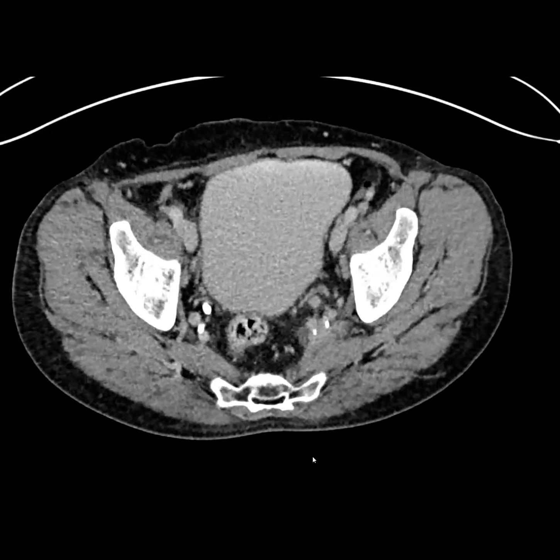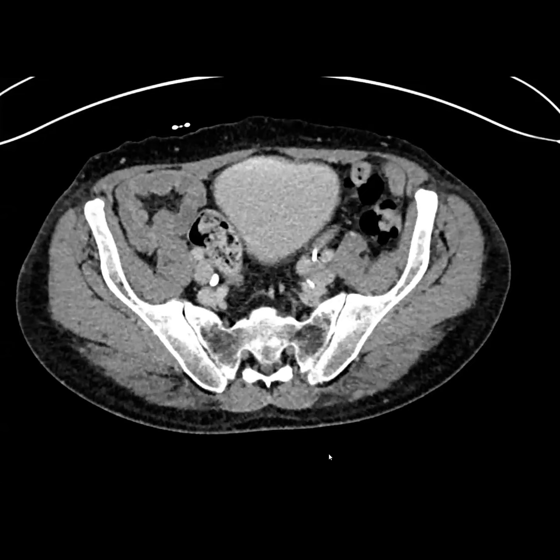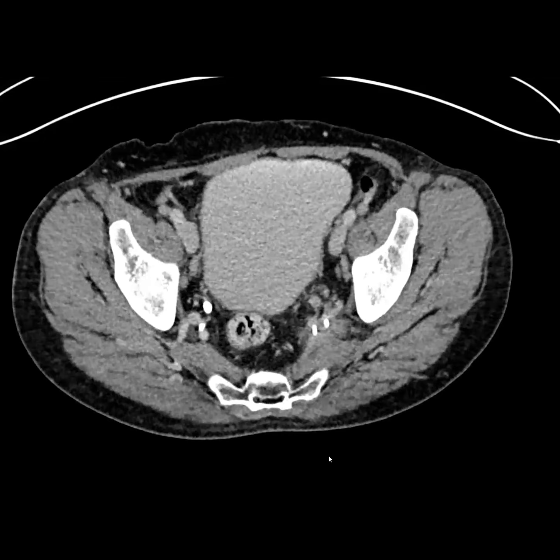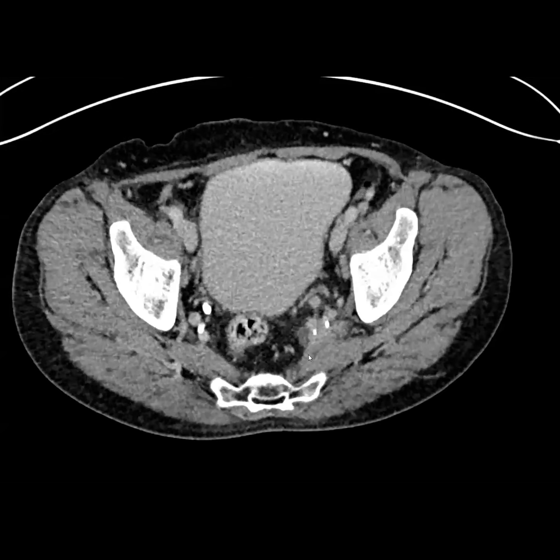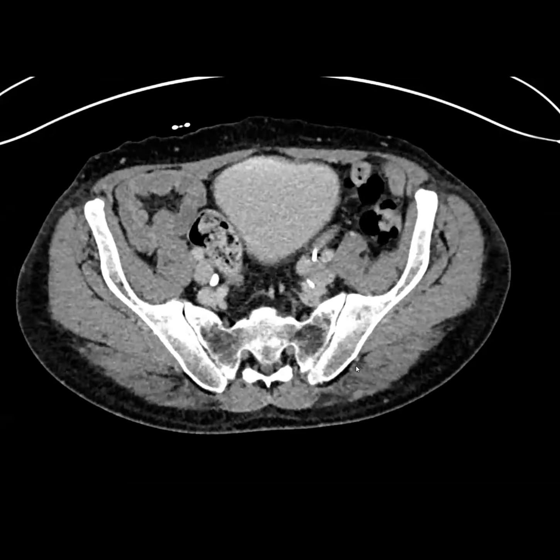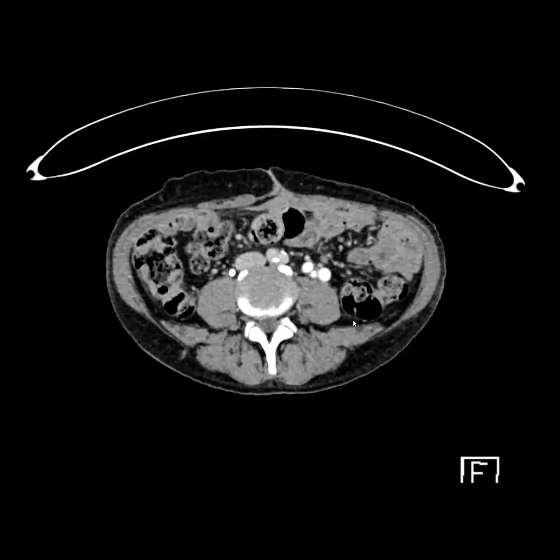There's another finding. Well, there's soft tissue mass or thickening in the left. Right, yeah, here? Piriformis. Yep. Okay, good. There's soft tissue thickening. Anything else? I'll show you the coronal, or sorry, the sagittal. Anyone else? Anyone can speak up if they want.